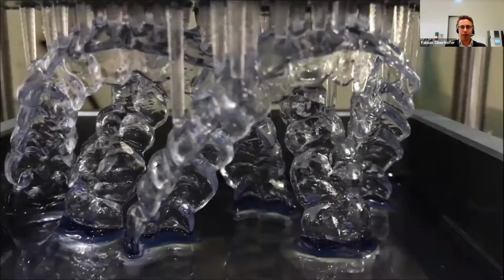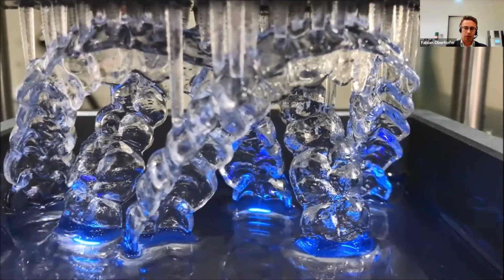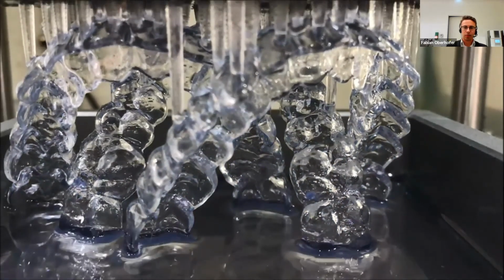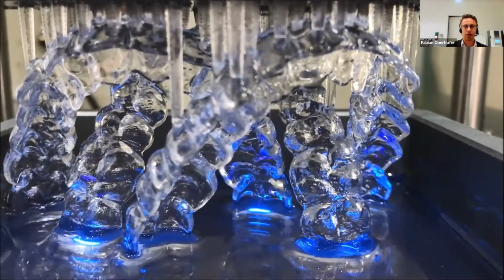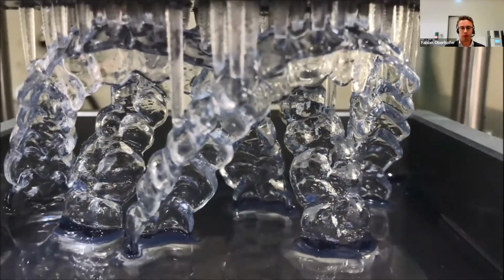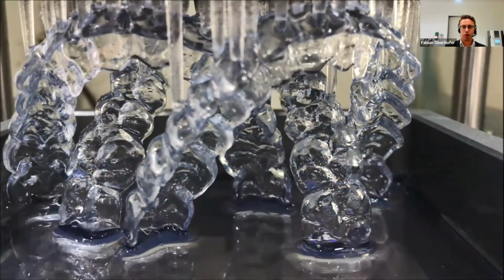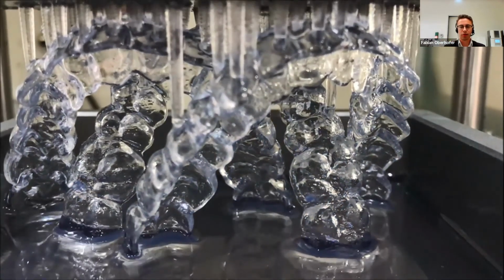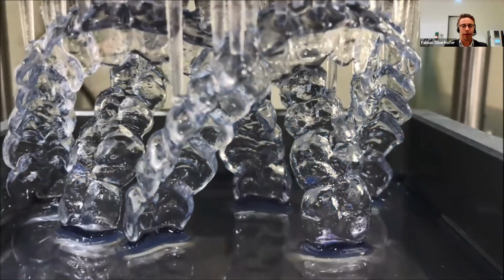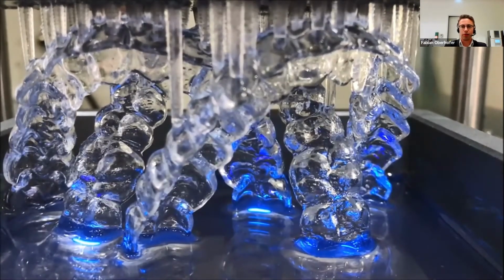And how the printing looks inside the printer, I have here a short video. The blue light is where the part gets cured. We print here, I think, 3 splints at once, which is possible with 3D printing. After a layer gets cured, the whole platform rises up, new material can flow to the parts where it was cured, and it goes down. This continues until the whole object is printed.